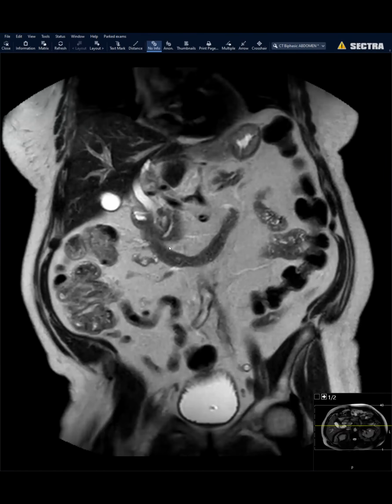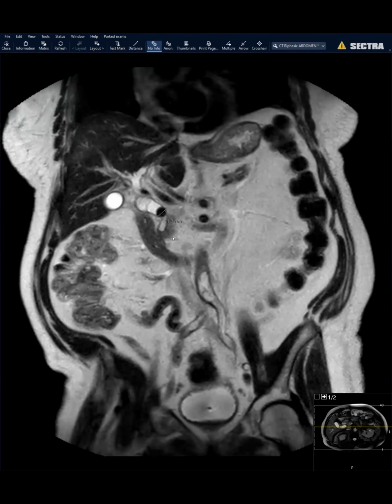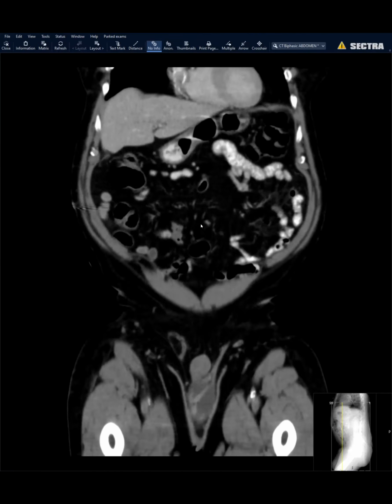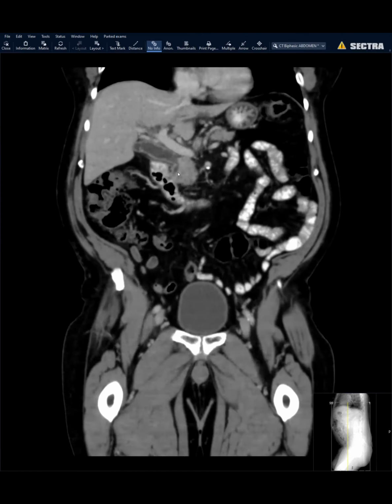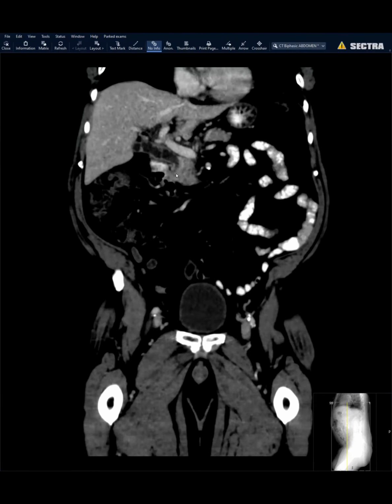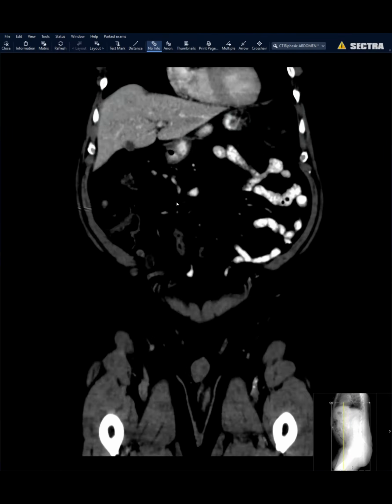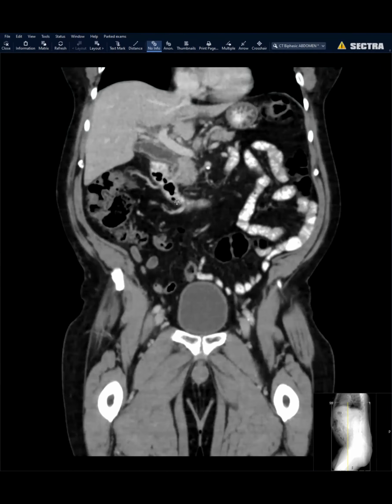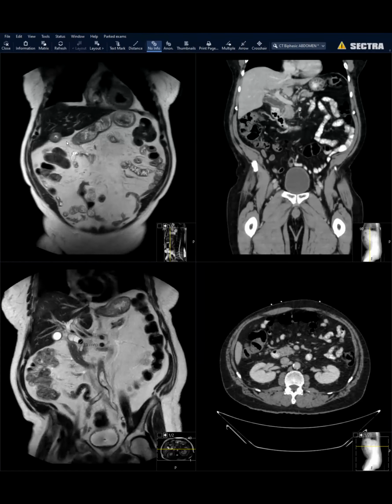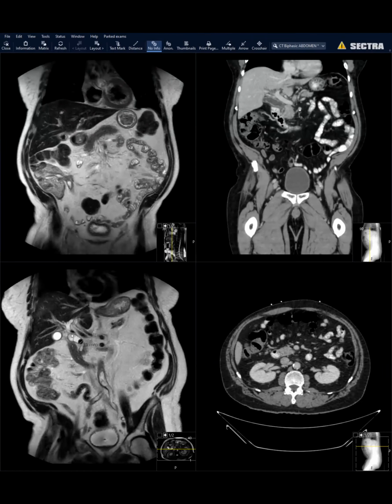Nice call. I think you could see that hyperdense thing in the cystic duct on CT too. We tried windowing it, but I didn't realize it was a stone. I thought maybe it's sludge or something. Yeah. There is a little bit of density here, but it did not really look like a stone on CT. Agreed. So looking at the old scan really helped a lot, and we could prove the point with this one. So it's a good teaching case.